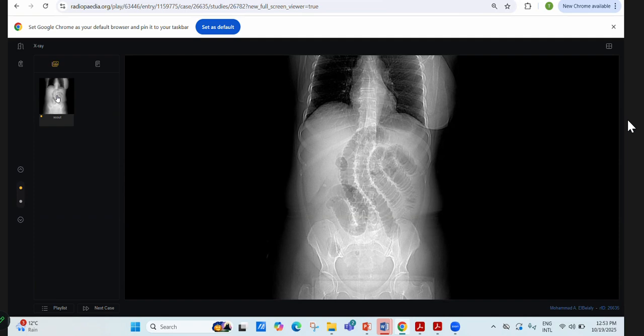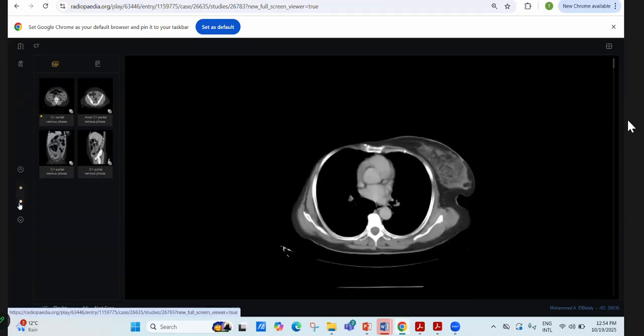I'm looking for any air in the hepatic region to rule out any intraportal venous gas, but there is no definite evidence. So this is likely a case of small bowel obstruction, and I will immediately inform the finding to the referring physician and would advise CT abdomen with contrast.